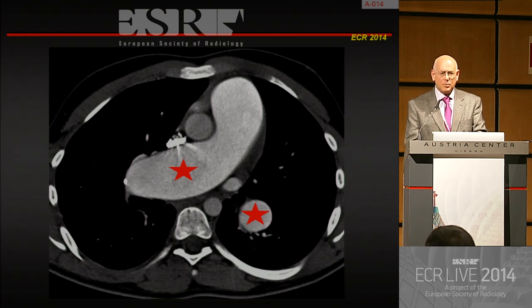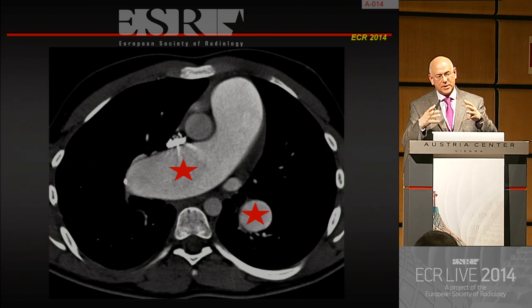And finally, more centrally, these patients will all, at some point or the other, suffer from dilatation of the pulmonary artery, because the arteries dilate as a consequence of the increased pressure that is needed to pump the blood through the narrowed pulmonary arteries.